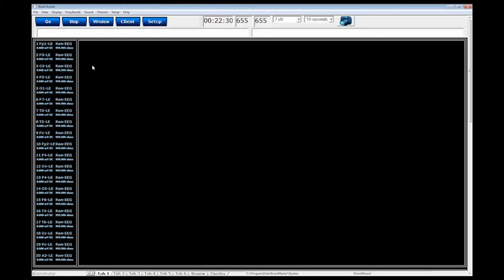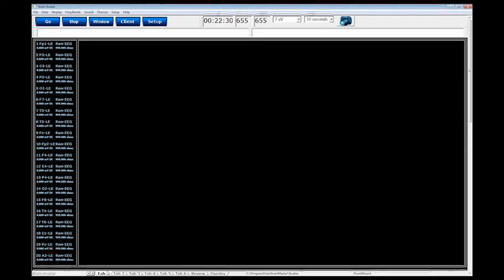The first thing we can do, as I said before, is have multiple tabs that have different bits of information on every single one of them. They might be relevant to exactly what you're doing, or they might be something that you want to just look at as a separate thing that may not be based on training at all. What I usually do as a first thing, and this is up to you, is I rename the tabs so that I know exactly what I'm looking at.